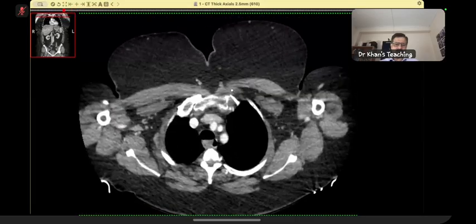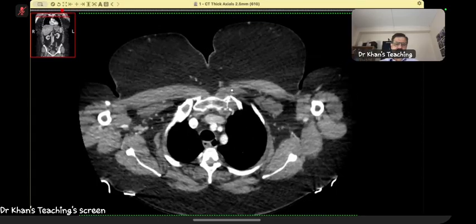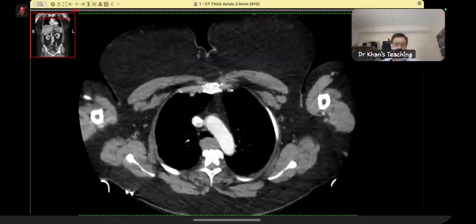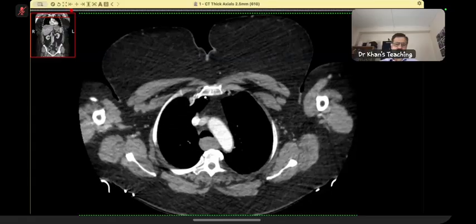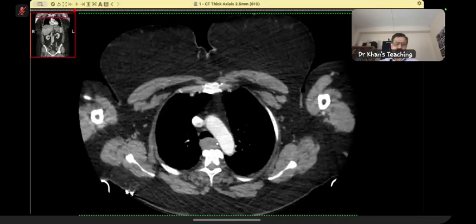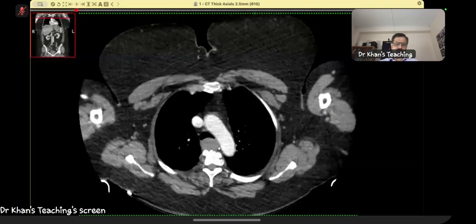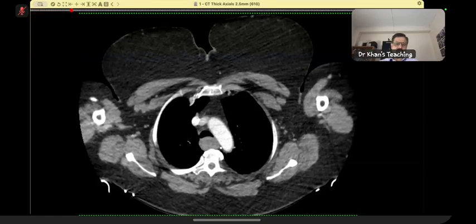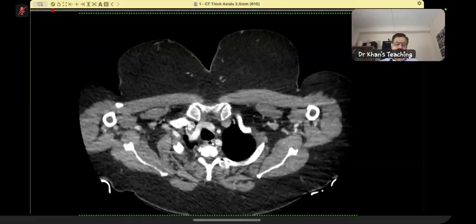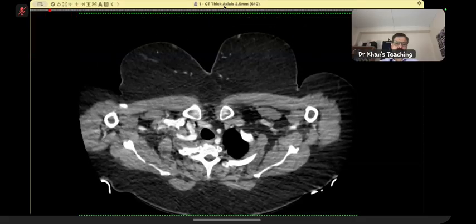Of course, intramural masses can also be malignant. That's the main thing. Now, to see if it is arising from the wall or is it compressing, sagittal is not a very good idea, and axial is the best sequence. One can see that this mass is there and it is causing compression. So it is very difficult to diagnose more than that. Just a bit of lumen is seen proximal to the mass.